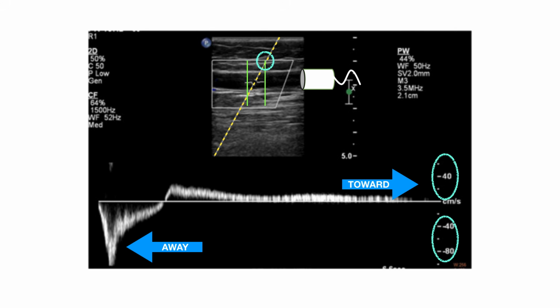So to end this, I'll give you guys a pop quiz. You can just go through this on your own time by pausing and starting the video. Here you go.